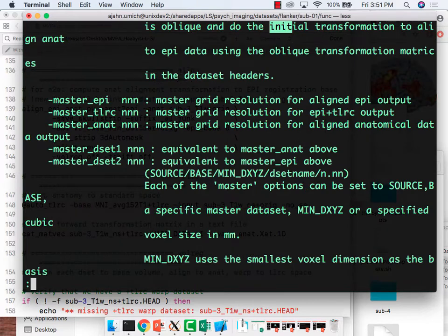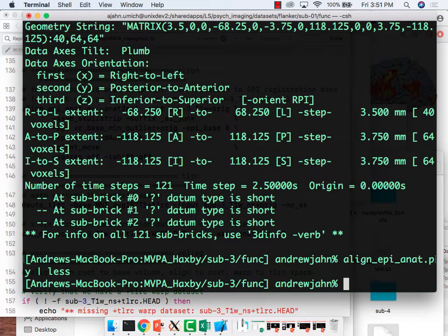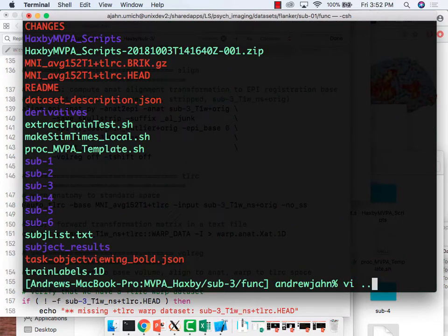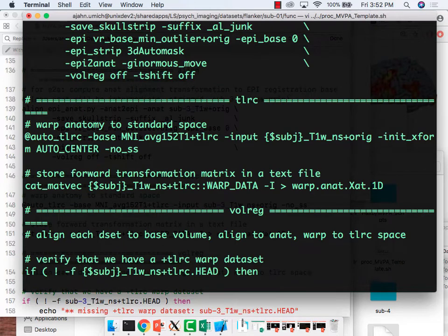No. Let's see here. Init xform auto center, yeah.